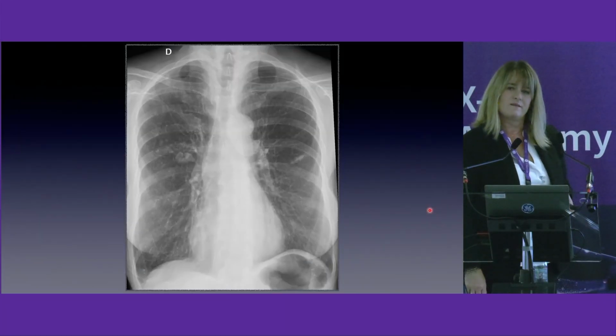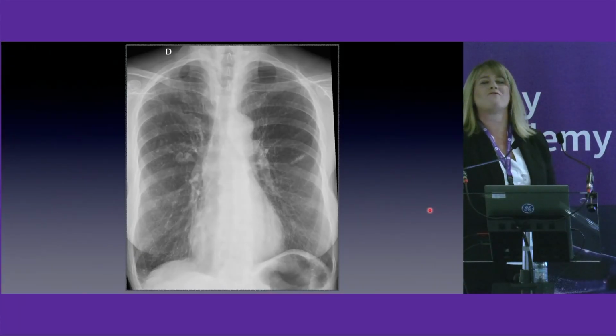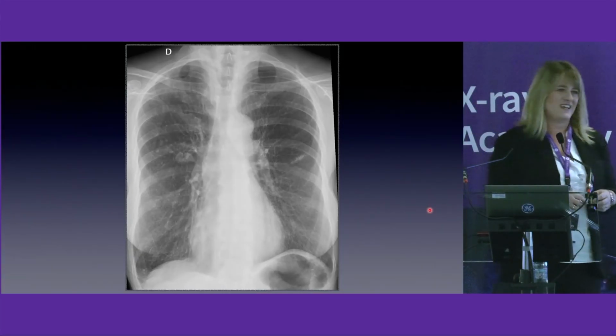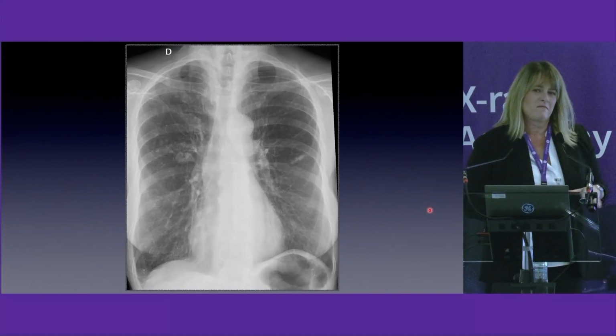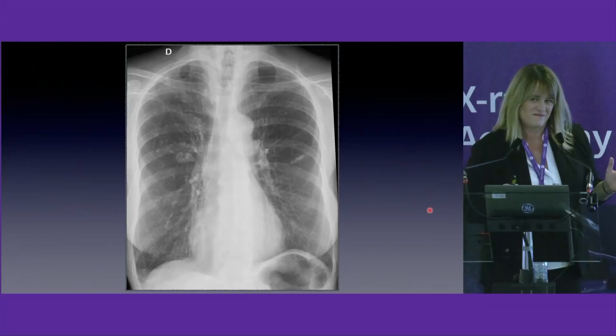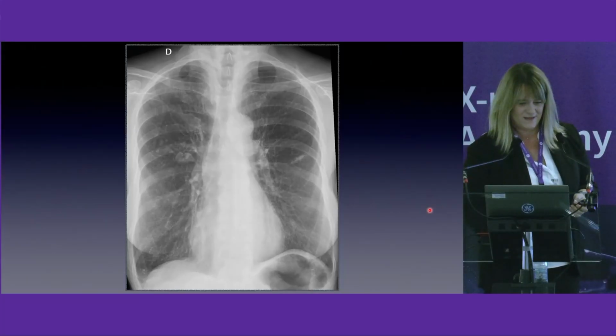What about this? More findings. I agree with you. So there's something pathological, or I think these three nodules, all of these nodules.